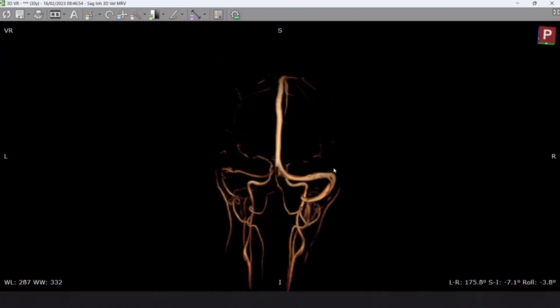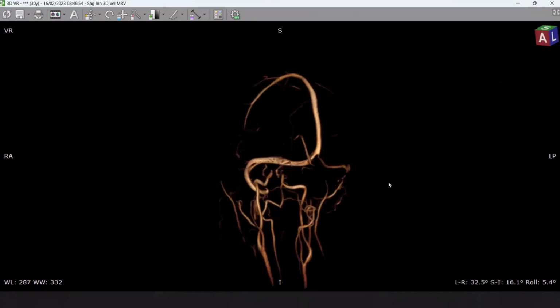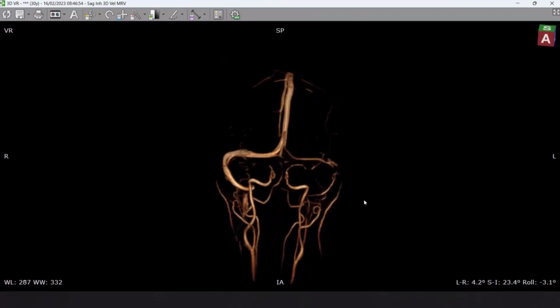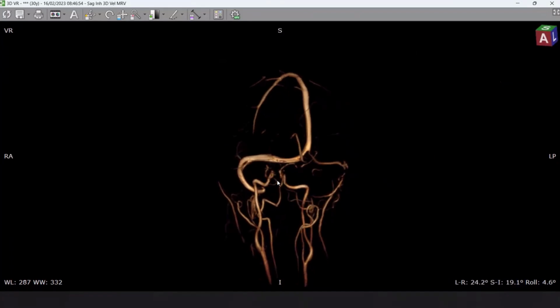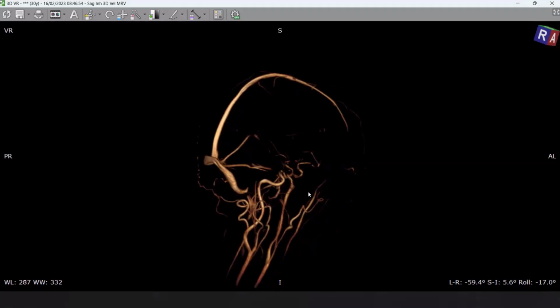It is not like the contralateral side. This is a contralateral side. The left side is the non-dominant side, but the right side is the dominant one, and we have abrupt occlusion along the internal jugular vein. Okay, if you have something like this, what will you search for? We proved that we have acute thrombus along the internal jugular vein.